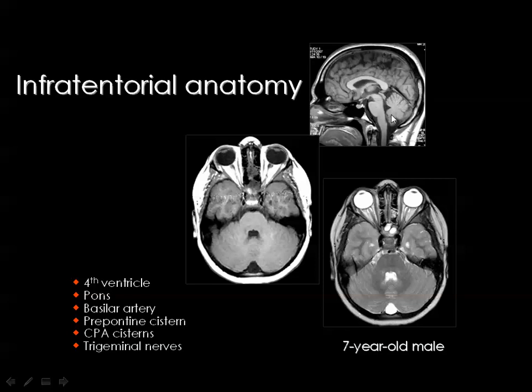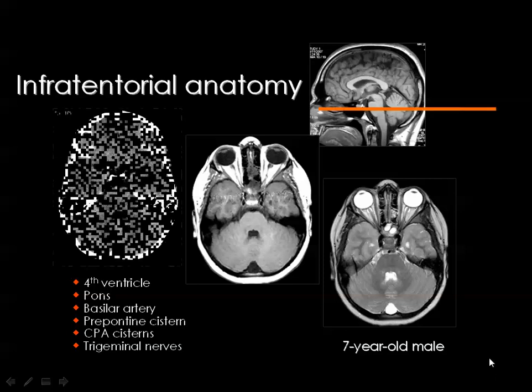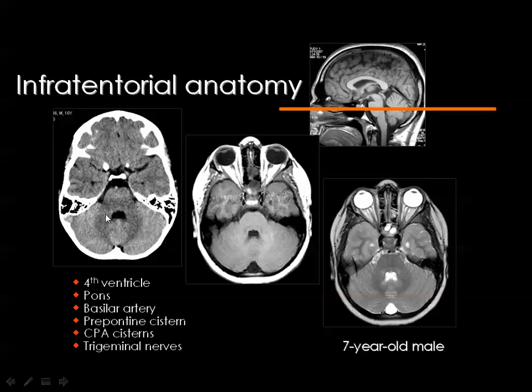When the fourth ventricle is large, then the largest part of the brainstem, which is the pons, is located in front of the fourth ventricle. When it is small from below, then the medulla oblongata is anterior to the fourth ventricle, while superiorly the midbrain is anterior to the fourth ventricle. Then if you have a section like this and the fourth ventricle is large, and you know that the pons is anterior to the fourth ventricle, then this is the pons and this is the cerebellum.